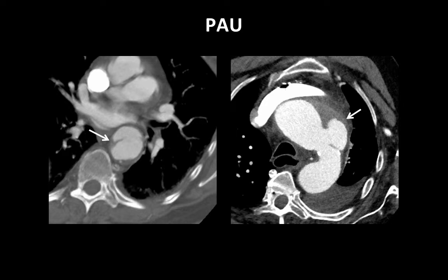There's also some hemorrhage in and around the wall of the aorta, indicating that this is a very active inflammatory process. And in distinction to the aortic dissections, these penetrating atherosclerotic ulcers are very localized. They're not always aneurysmal, but we do see a sort of discrete neck between the true lumen of the aorta and this little outpouching where the ulcer has occurred.